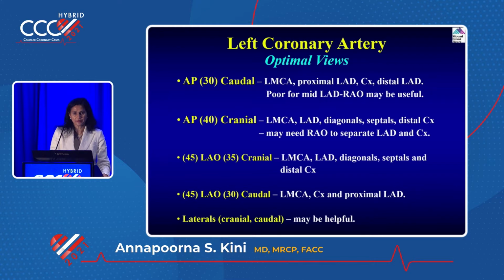LAD, diagonals. And distal circumflex, if you're seeing LPL, LPDA, you can see in the cranial view. And same thing in the RAO cranial. RAO cranial, like I mentioned earlier also, you'll be able to see if the RCA is totally occluded. And RAO caudal, right, is circumflex, proximal left main, proximal LAD, proximal circumflex. That's the view you want to use if you're doing left main intervention, distal LAD.